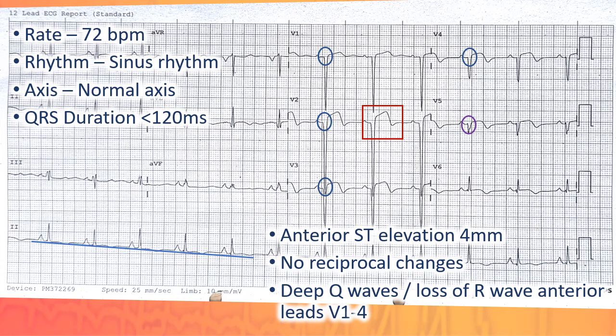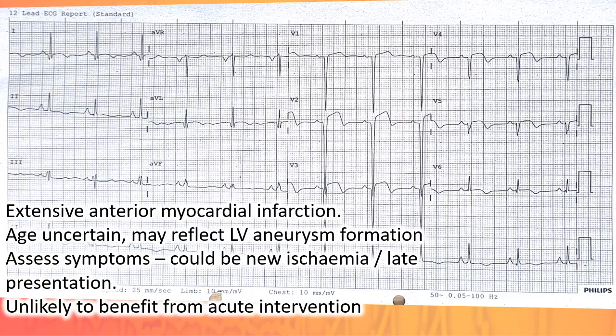Also note that the baseline is moving. This is an extensive old anterior myocardial infarction. The age of it's uncertain, and it may well reflect an LV aneurysm formation. This might be the patient's ECG the day after their infarct. It might be these ST segments would still resolve.